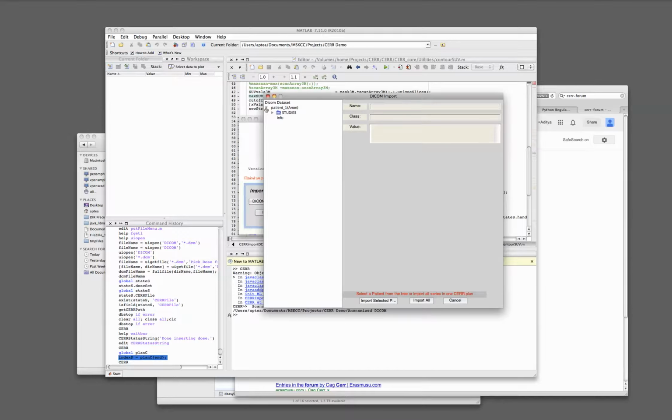present in that directory. So under here, you'll see there are 4 series. First series is CT modality, second series is RT struct data, which are anatomical structures contoured by physicians. Third series is volumetric RT dose that was delivered or rather planned.